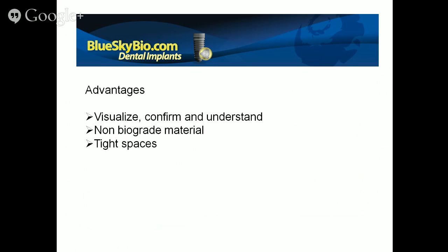When you're using the model-based approach, you're going to have the model with the post. The post is going to hold the metal cylinder, but from the inside of the metal cylinder and not from the outside. So that's actually going to be an advantage in terms of saving spaces, especially for tight cases.